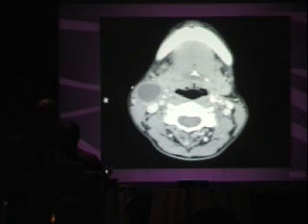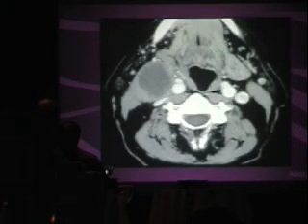And another thing that lives in that location is just lymph nodes. So whenever you see a big, round, centrally necrotic thing like this, you should always think, could this be a necrotic lymph node? A little less likely and common for it to be isolated. And of course, it depends on a lot of other things. But this actually has a focal large mass and more irregularity here that's both pointing out and pointing in. This was a large necrotic lymph node. And this was a patient with a squamous cell carcinoma of unknown primary.